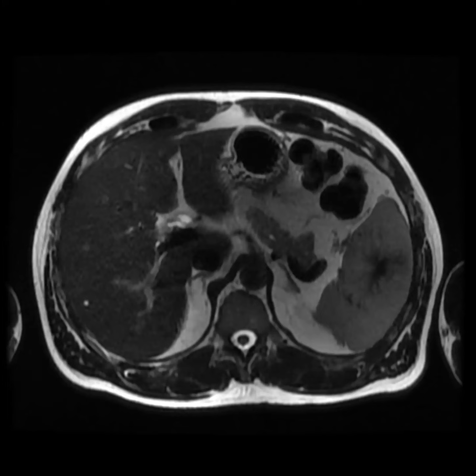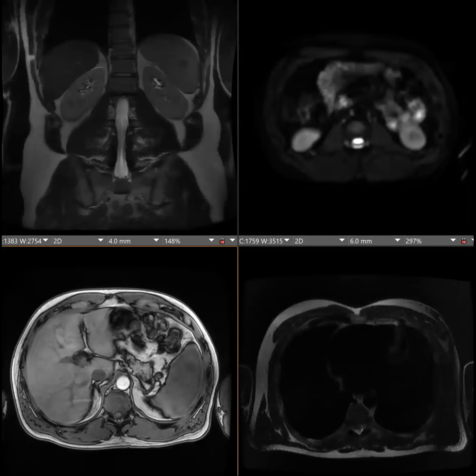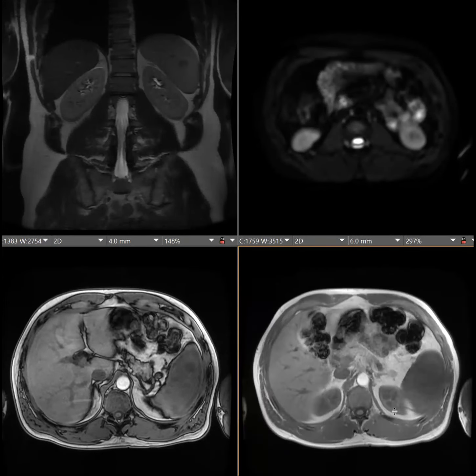Yeah, I think Aarti has shown multiple of these cases. I am curious, is that hemosiderin in the scar? I think so. Okay, let me show you the in and out of phase. Here it is. Last week I showed a littoral cell angioma, and it also had drop on the in phase, and that was one of the key features, hemosiderin. So here's the out.